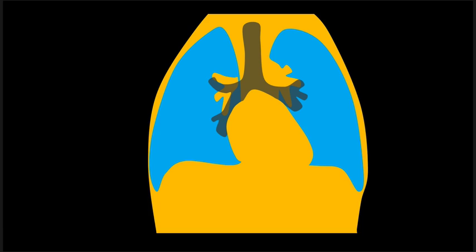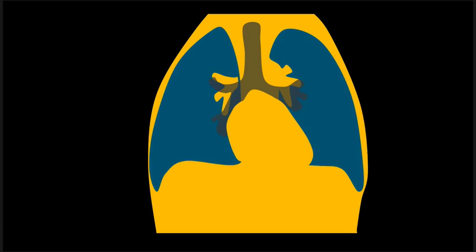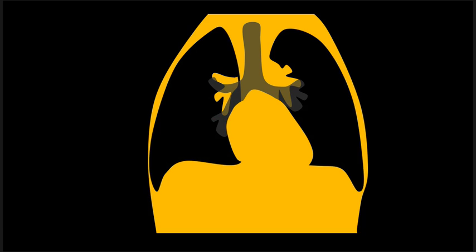And of course the lungs are air, normal lungs, right? Normal air-filled lungs. You don't see anything except for a few vessels and a fissure. So you really are only dealing with two main types of contrast here, excluding the bones. We're not talking about bones here. Just the soft tissues are all soft tissue density, and the lungs are air density. So you know what else is soft tissue density? Pneumonias, or cancers, or hemorrhage, or all those things that we mentioned before that are in the differential for an airspace or an alveolar opacity.